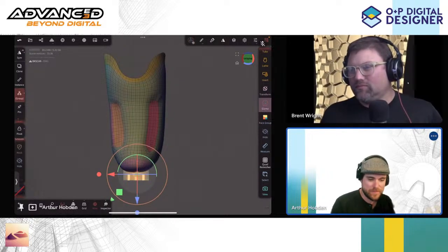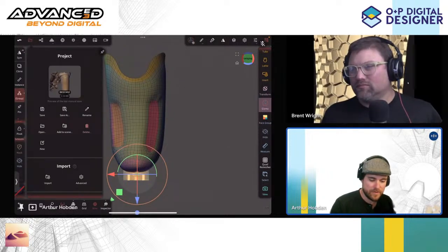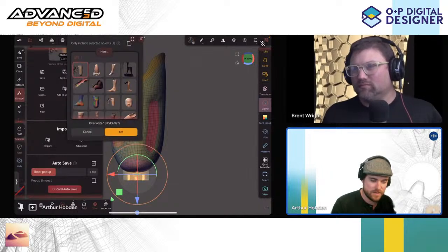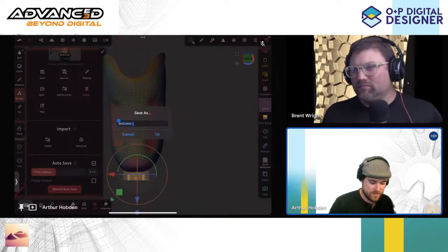All right, so if that's the case, I'm going to export this. So let's save as new. This is going to be BK socket test.